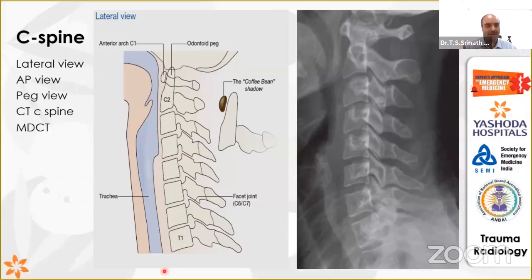So what are you going to look for? A widened interspinous space or the facet joints. These are the things you are looking for. Fractures mean not only that there is a fracture, that is not over, because sometimes pedicle fractures will not create anything. When you call the spine surgeon and say there is a pedicle fracture, he will ask whether there is a flexion injury, an extension injury, whether there is compression on the nerves.